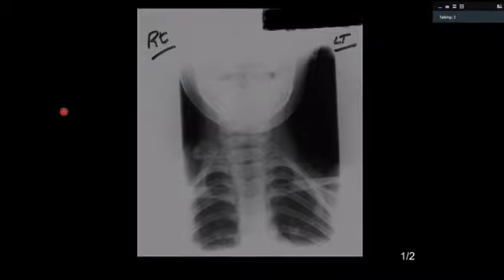So my first possible differential was it could be an omovertebra. I can't see anything in the lung fields. The remaining bone appears to be normal. So omovertebra will probably be my most likely differential for this.